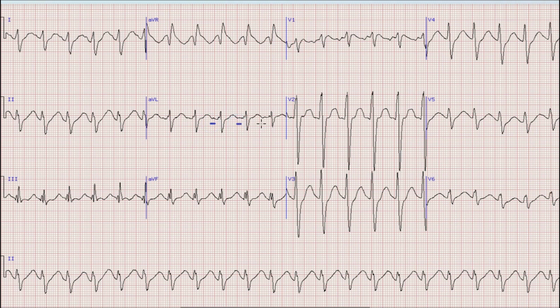Here you can see that there are prominent and upright P wave before each QRS complex. Similarly, there are negatively deflected P waves in V1. Presence of upright P waves in limb leads with negatively deflected P waves in lead V1 means that it is a sinus rhythm.